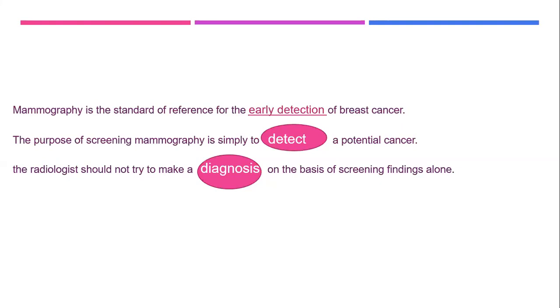Sarah. Yes, Dr. Abba. Why did I highlight it? Okay, usually in screening mammogram, this is our aim: there is abnormality or no abnormality. Is it negative screening or positive screening? Okay, so after that, if there is any abnormality, we will give it BI-RADS 0. Then after that, to do a diagnostic mammogram, we have to diagnose.